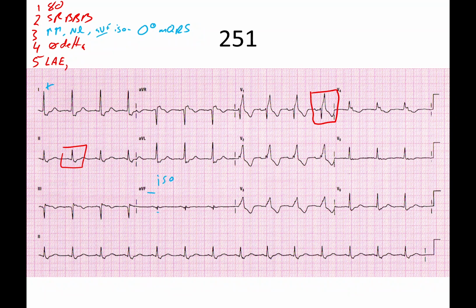We're going to look to see if there's a left ventricular hypertrophy or left ventricular enlargement, and you can see that the total size of your S waves pretty much don't exist, and you don't have very tall R waves either in your V1 and 2, 5 and 6. So we're going to say no left ventricular enlargement, and is my R wave greater than my S wave in lead V1? My R to S ratio, and that's definitely not the case either. So we have no right ventricular enlargement either. So that brings us up to step 6. I'm going to go ahead and we'll do a different color.